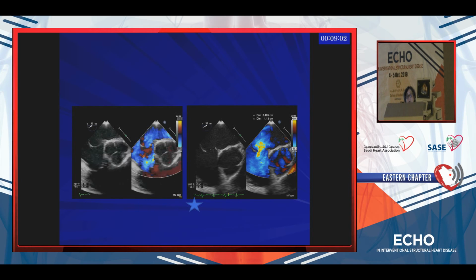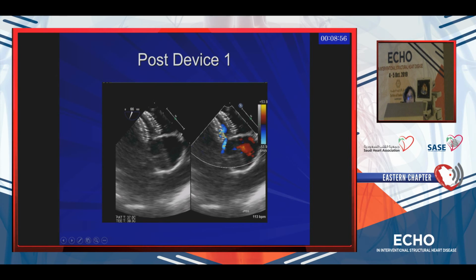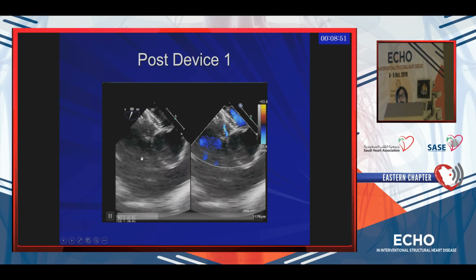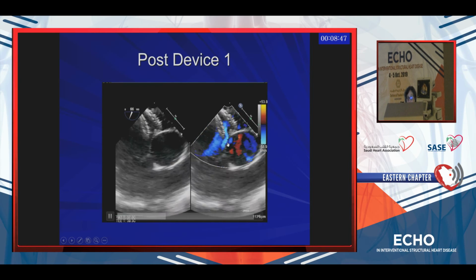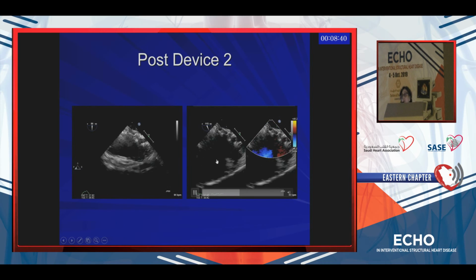To me, it looked small, but the interventional said it is okay. So they managed. They tried to close it, and it was not a good one. You've already seen one of my colleagues demonstrating this. So still with some flow, and this patient ended up with another device which managed to close the area well.